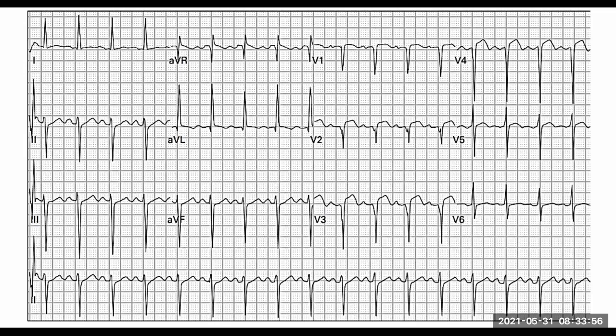Okay, but that can just be a rotation of the heart. Right? But what's happening in V6? What do we notice? So we have a PQRS. What's the next letter that's supposed to come? In other words, what's this wave? PQRS. That's a T wave. What do you notice about your T waves here? Flattened, very good. Okay, so that means something's going on.